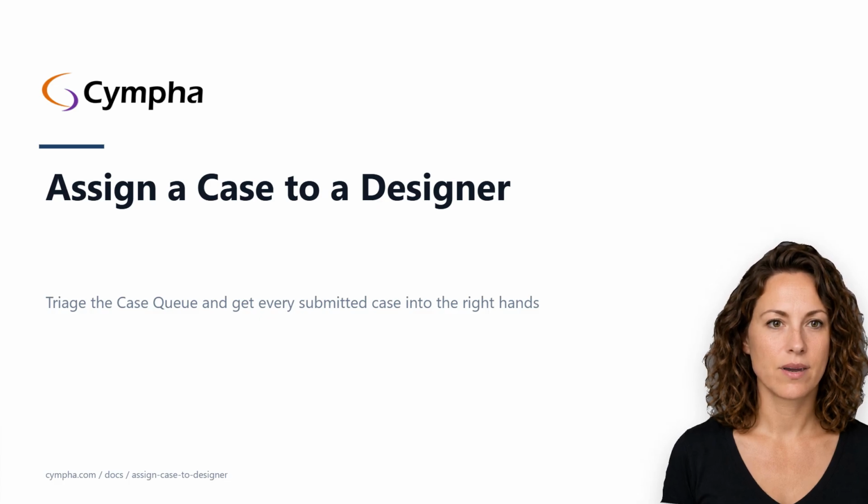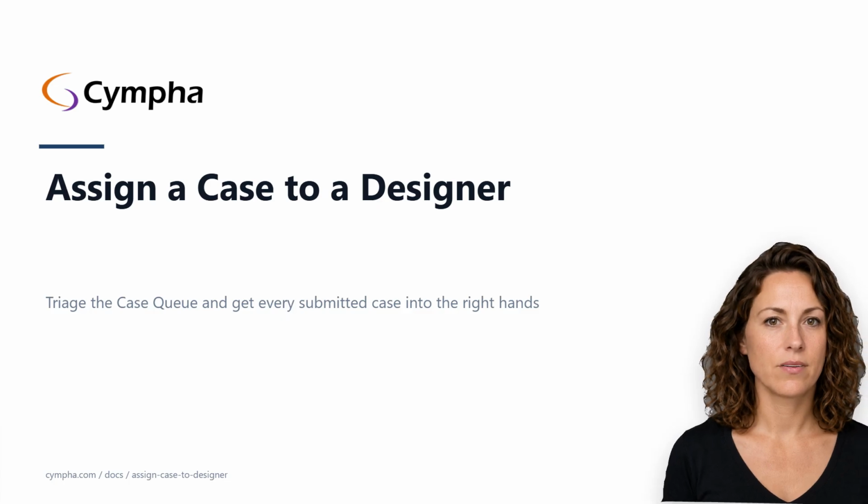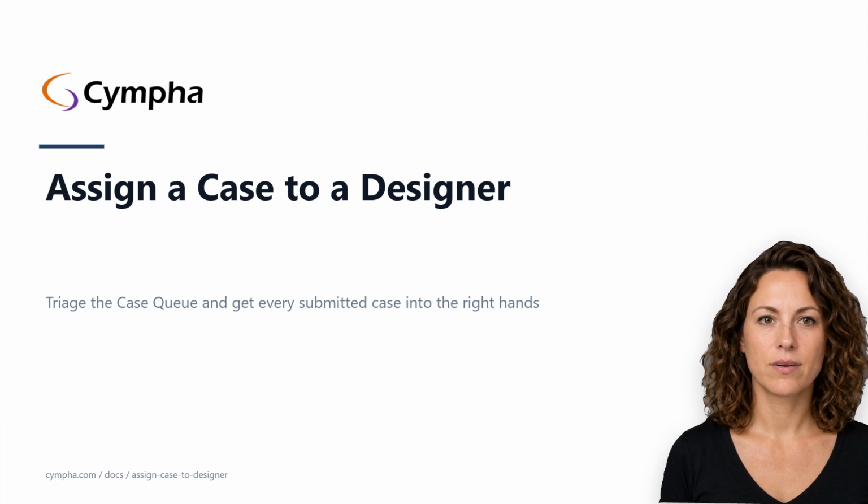By the end you'll know how to triage the case queue, open a submitted case and judge whether it's ready to design, assign a designer from the dialog, what happens to the case status the moment you confirm, and why AlignerBot cases never appear in that picker at all. The first pass takes about 6 minutes. Once you know the queue, about 30 seconds per case. Follow along on screen, or just listen, the written guide has every click.